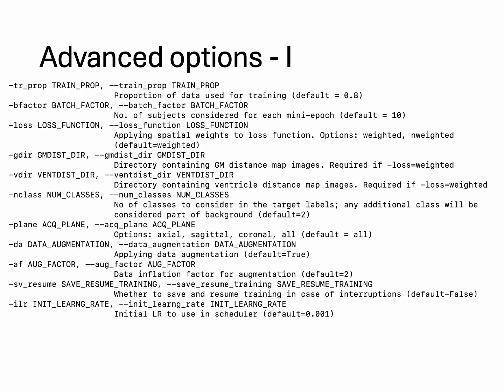Okay, and these are the advanced options available. Most of these options have default values which have been optimized to give a good performance. They have already been shown to provide optimal performance. So if you want to run without touching any of these options, that's perfectly fine.